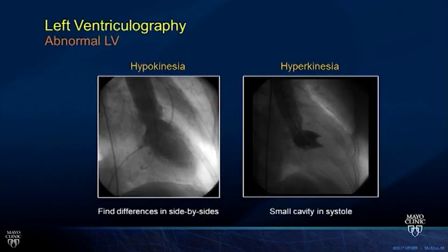If you're seeing other structures, then that's a sign of pathology, such as mitral regurgitation or other pathology. Here are some still frames of an abnormal LV-gram in systole. You can see that this ventricle is not obliterating as much as it should. They typically would show you diastole and systole, and then you could say that this patient has a reduced ejection fraction. Here's an example of a hyperkinetic ventricle with almost complete cavity obliteration. So this person probably has severe hypertrophy of their ventricle.